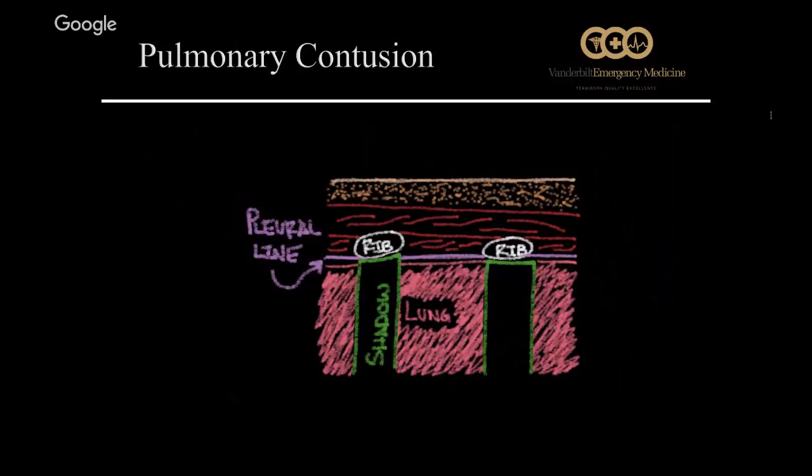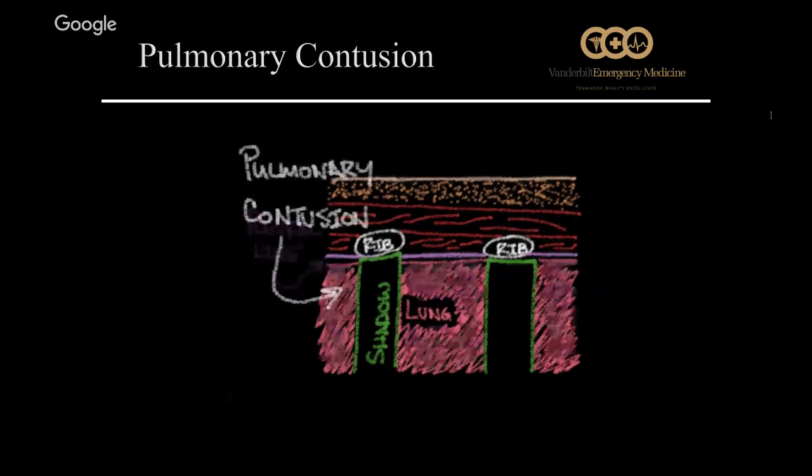All right. And then pulmonary contusion, I know you guys talked about B-lines before, but in the setting of trauma, if you see large collections of B-lines, that can represent a pulmonary contusion. Next slide. So these lines definitely need to come from the pleura and not from anywhere else. Next slide. They should move with respiration and again, should arise from the pleural line itself. Next slide.